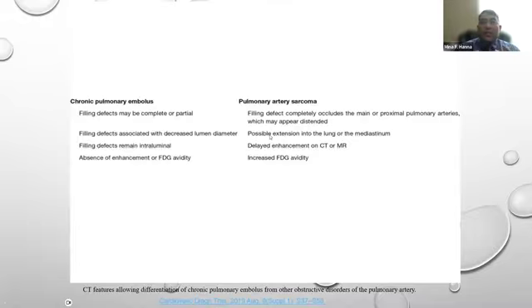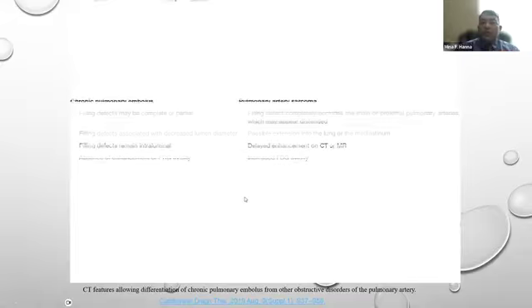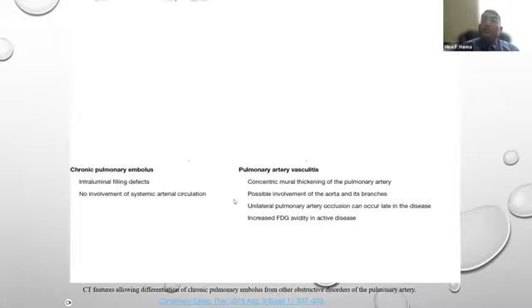And if you suspect there is an enhancing lesion, not PE, you go for FDG PET-CT, and you will find FDG uptake and avidity of this lesion. You can also do some delayed enhancement of this case, and you see that this lesion is retaining more contrast. You may find also the sarcoma extending beyond the vessel wall, but the embolus will be inside the vessel. In the follow-up, sarcoma will increase in size, but the PE within 1 week or 10 days will shrink and decrease in size.